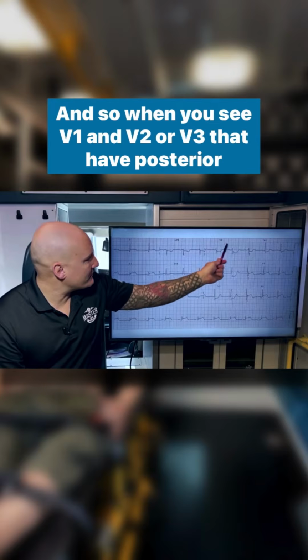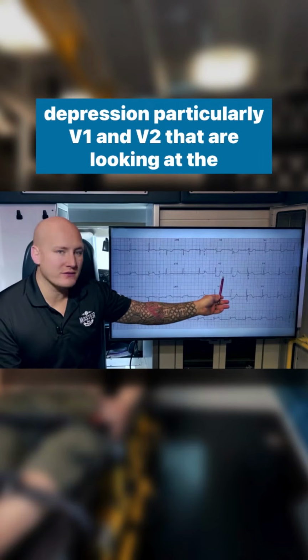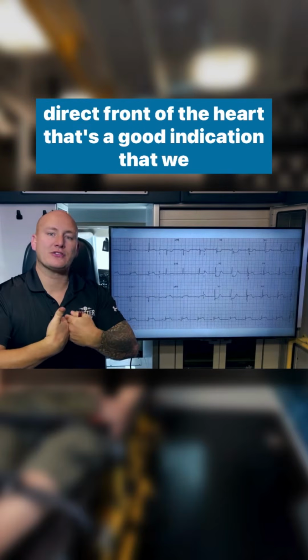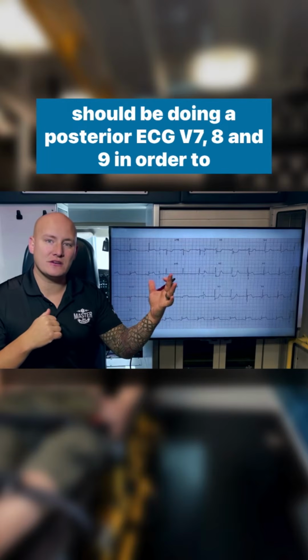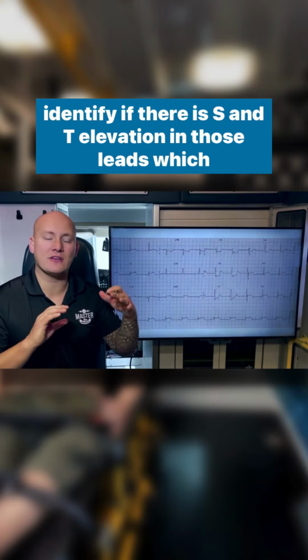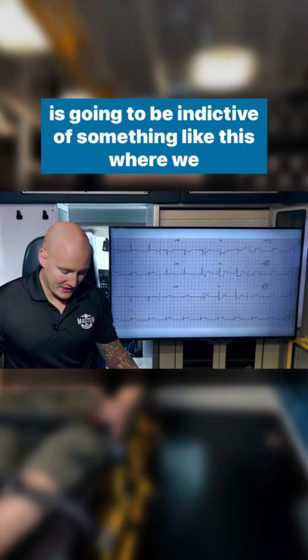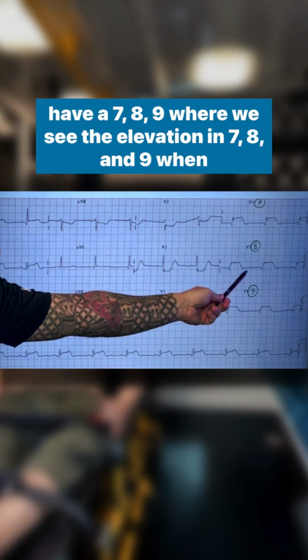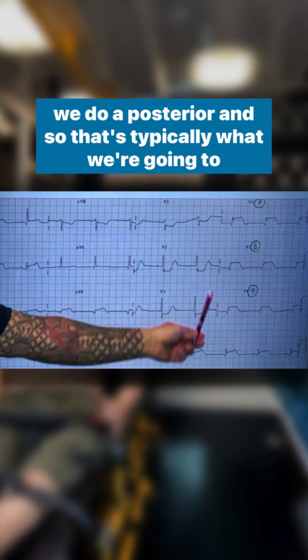And so when you see V1 and V2 or V3 that have posterior depression, particularly V1 and V2 that are looking at the direct front of the heart, that's a good indication that we should be doing a posterior ECG, V7, 8, and 9, in order to identify if there is ST elevation in those leads, which is going to be indicative of something like this, where we see the elevation in 7, 8, and 9 when we do a posterior. And so that's typically what we're going to see.